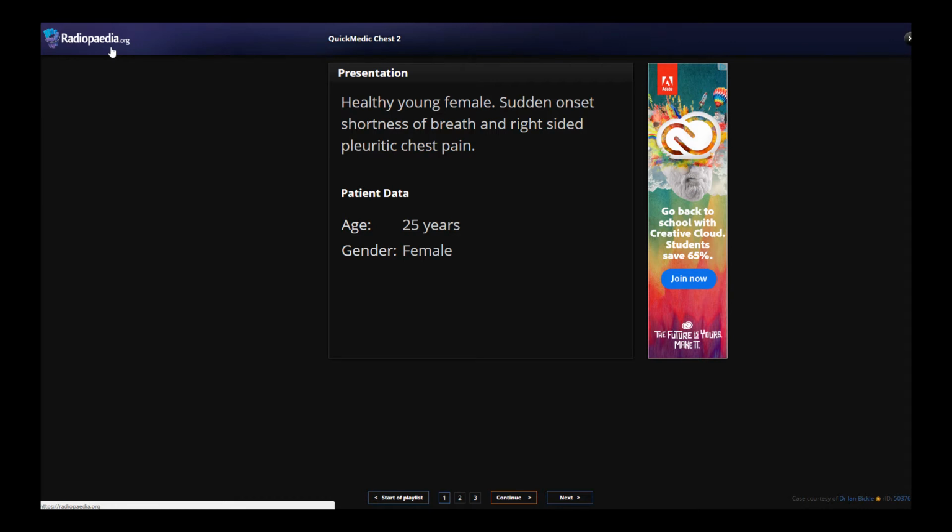I'm going through these chest radiographs with you because they are ones that are pertinent to finals, they're pertinent to medical school cases, and we're going to go through them. I'm not a radiologist, so it'll probably be more helpful for you because you're unlikely to be examined directly by a radiologist on radiology, if that makes sense. Moreover, there are more things you're going to come across in undergraduate medicine, but also in the first couple of years in the hospital. So let's just start.